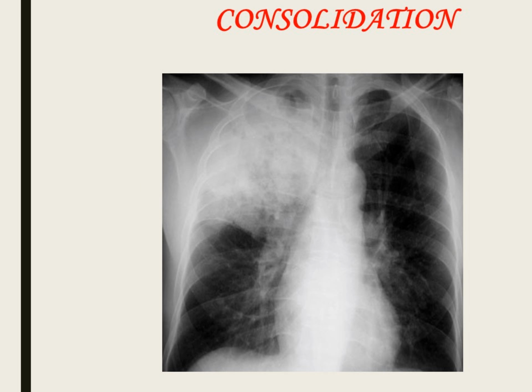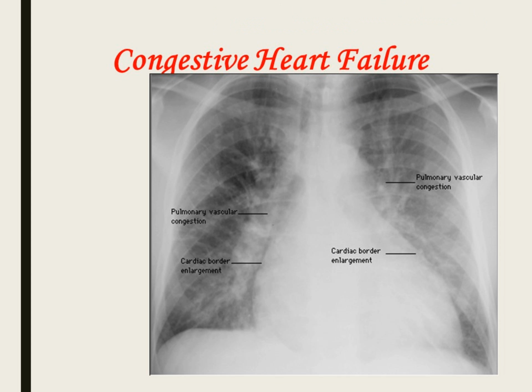What about here? Similar stuff, not as well defined anatomically, but there are some air bronchograms you can follow. More of a diffuse infiltrate. We've all seen these things, right? Pneumonia. What's this? Edema, exactly. So that's another big thing that we see frequently.